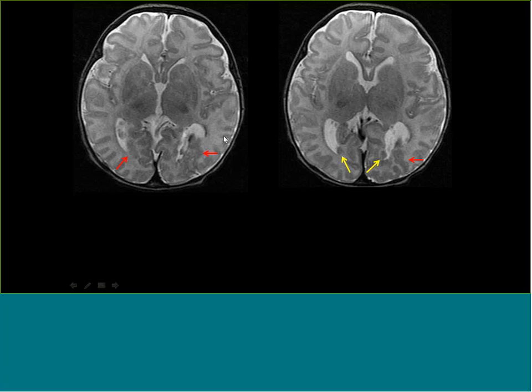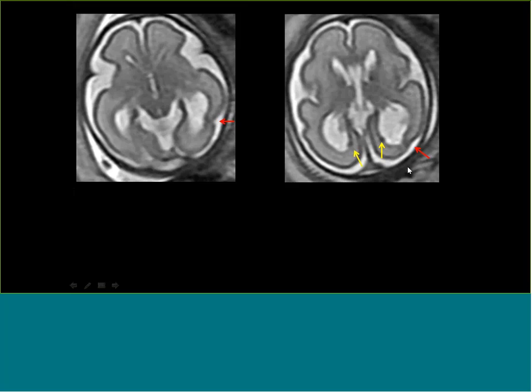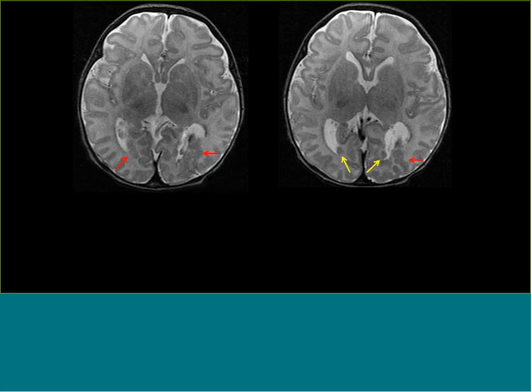And here's the postnatal image. So you can see the heterotopias that are present bilaterally, and also this abnormally enfolded gyrus here, and you can see it here also. So that original fetal abnormality turns out to be an area of regional polymicrogyria. So again, here's the fetal. It is really fascinating. So here's the fetal, and then here's the postnatal.